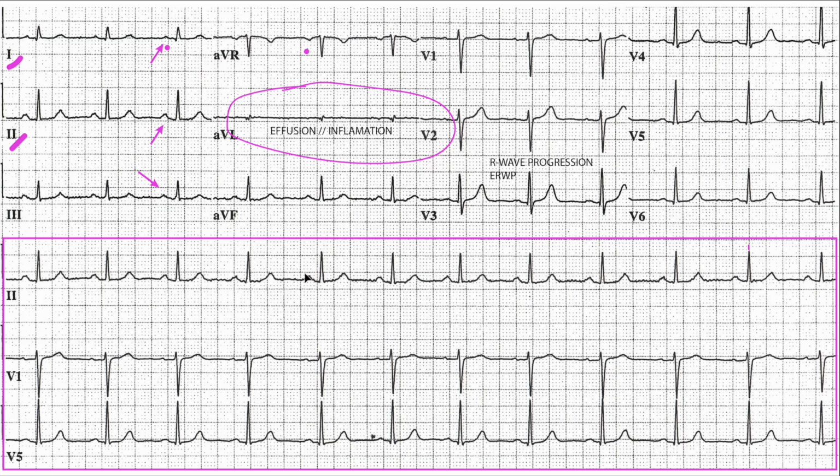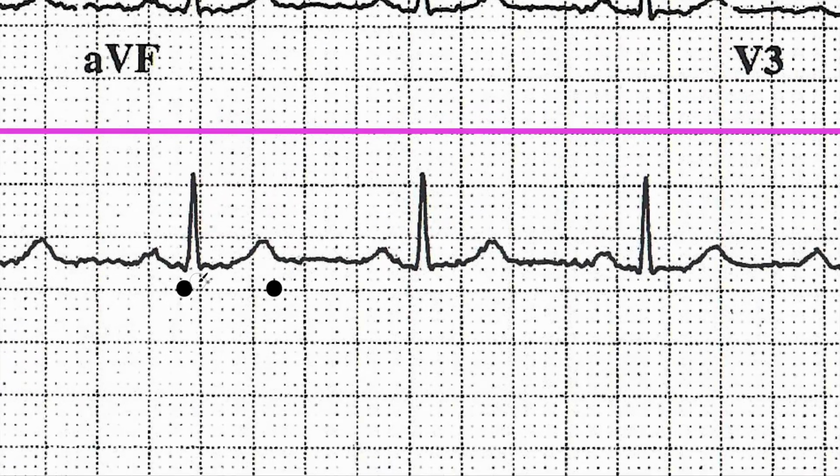What else? Oh yeah, also the TP segment here. When you talk about pericarditis and whatnot, this is a very important thing to look at, but here, I just want to mention it. One of the things I like to do is take a look at the QT. Your QT is the depolarization and repolarization. When you measure that, you are trying to figure out if you have a prolonged QT segment, which would indicate an issue, right? Sudden cardiac death and all that.